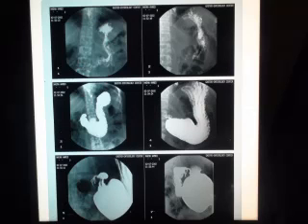Now also this is a hugely dilated stomach reaching down to the pelvis, and here this is the duodenum. As you can see here, after waiting about 1 or 2 hours, only a thin rim of barium passed through the duodenum to fill here part of the duodenum, but it's a hugely dilated stomach reaching down to the pelvis due to gastric outlet obstruction or cicatrized duodenal ulcer.